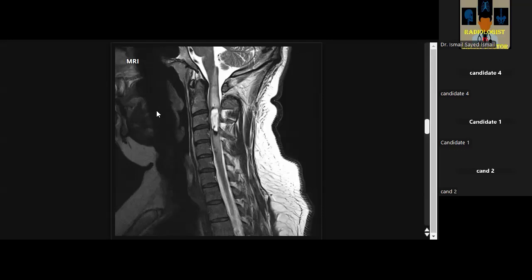A hemangioblastoma is also a differential; however, I do not appreciate other features like flow voids. To proceed, I will compare with previous images, and in this current study, I will check the rest of the neural axis to check for other lesions, whether it is solitary or multiple.